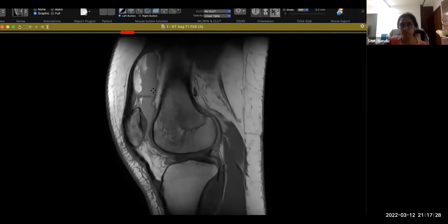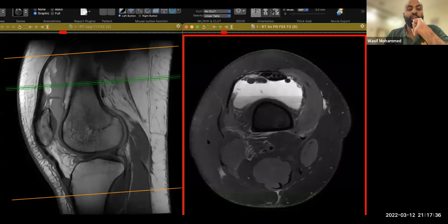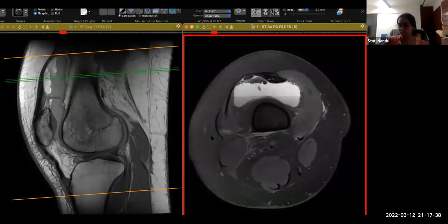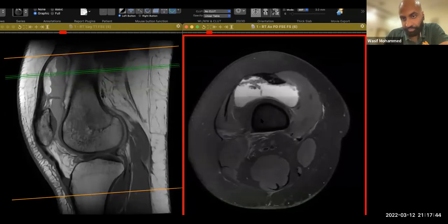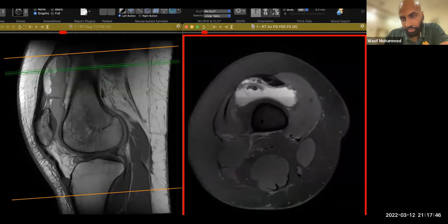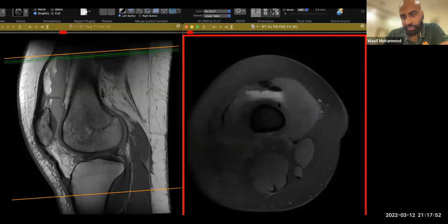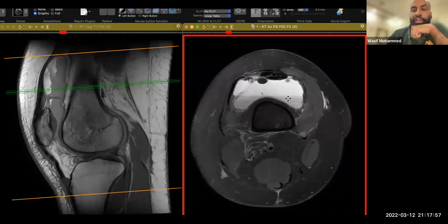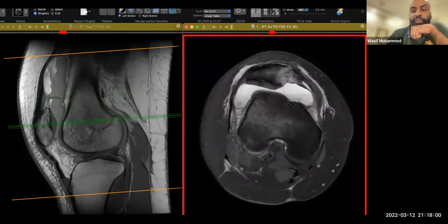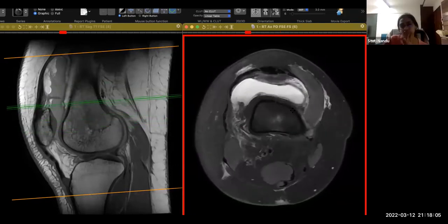structures, right? So that's why I showed you the T1. On T1, you can see that it is hyperintense, okay, and it is showing suppression on fat saturated images. Okay, and in fact, you can see these bubbles rising through the effusion here. So just if you paid a little attention, plus this is your fat fluid level. Okay, so more commonly what we get is a clean layer of fat within the effusion in cases of lipohemarthrosis, but this is also one of the presentations where you can have fat globules.